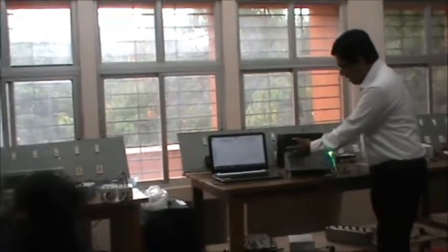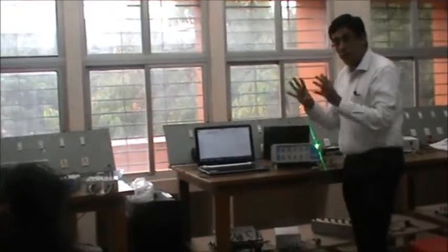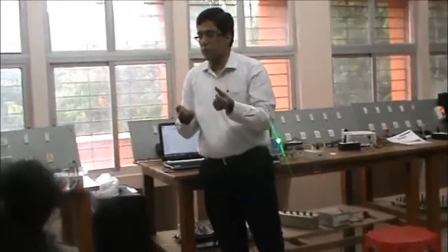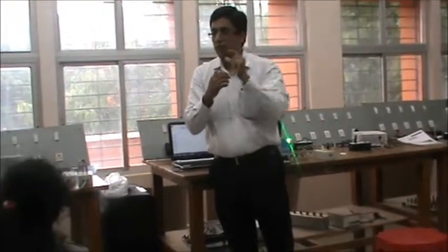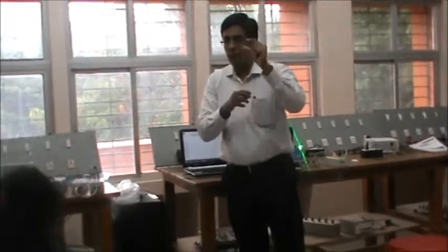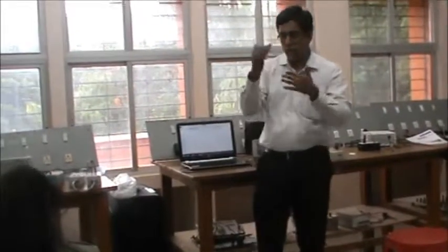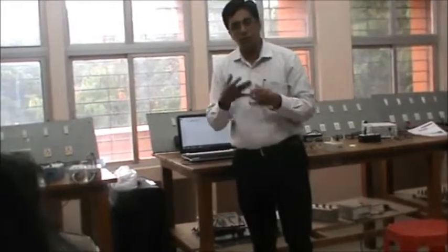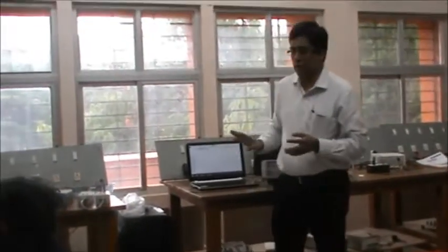This is a 10-channel data acquisition system, wherein 10 different physiological signals can be monitored simultaneously. This also does online FFT, offline FFT. So it becomes very useful. For example, you can put ECG in channel 1 and a pulse in channel 2. You can do a comparison of ECG with pulse, or ECG with phonocardiogram, or ECG with respiration. Or else you can even directly capture 10 different parameters simultaneously. It is like a multi-parameter monitoring system.